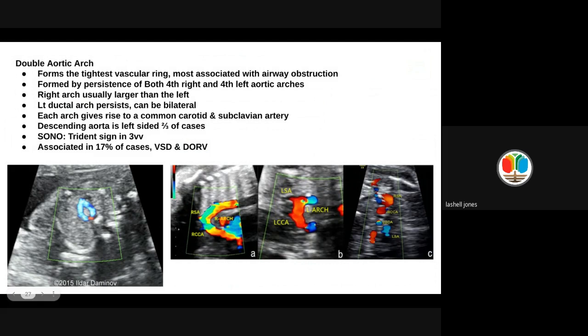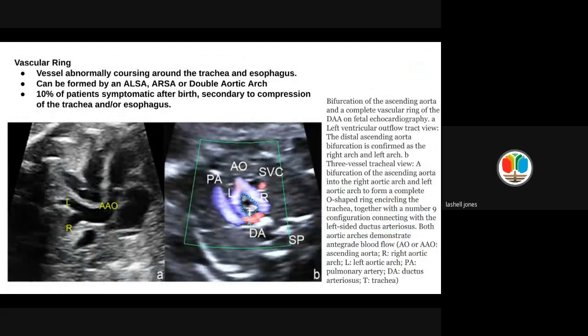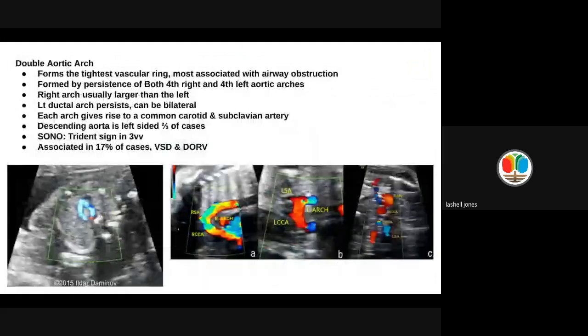Right. So just to look back at the vascular ring one more time, you kind of see the difference there. You can see the difference when you look here.